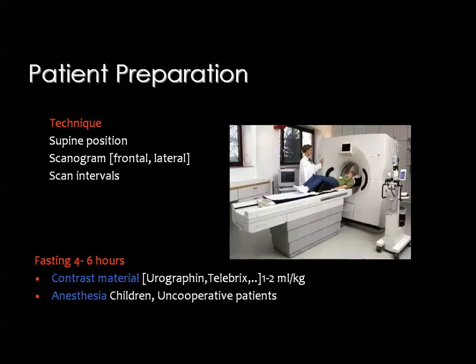Then we came to the CT scan, and CT is considered one of the valuable modalities for evaluation of the spine at a time before the era of MRI, and now its role has regressed a little bit as a primary imaging modality for the spine.